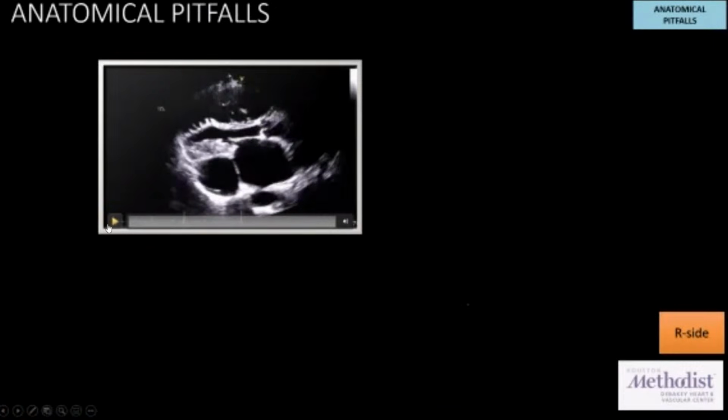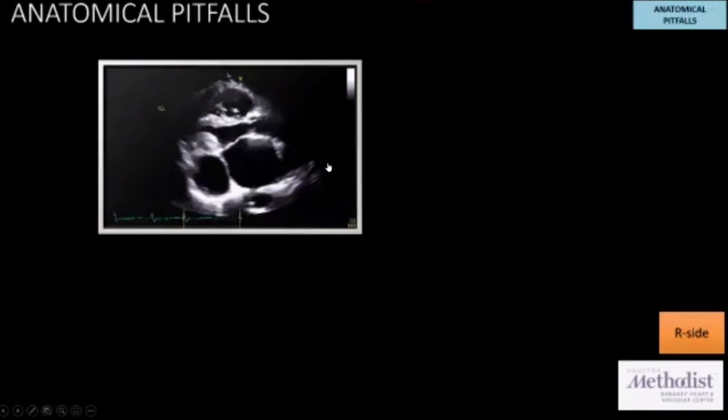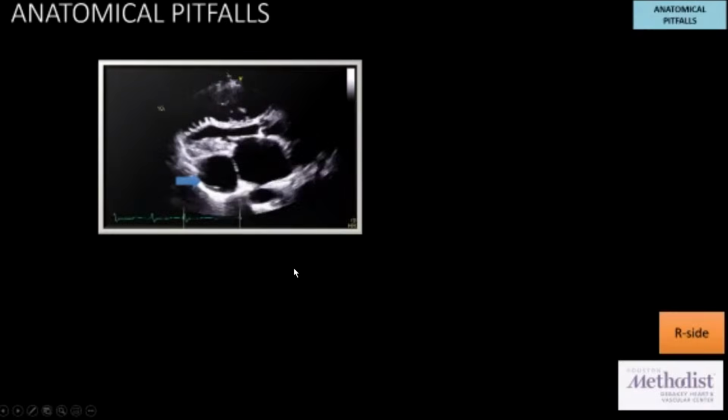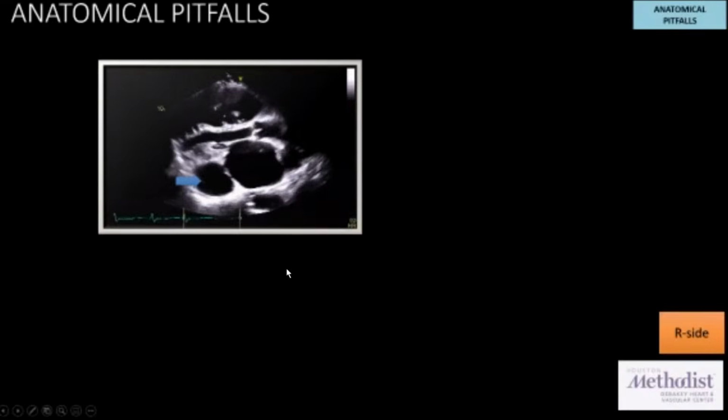Let me see if anybody can guess this. Any of the fellows on, please take it. Unmute yourself if you want to say something. I'm sure you know which structure I'm pointing to.